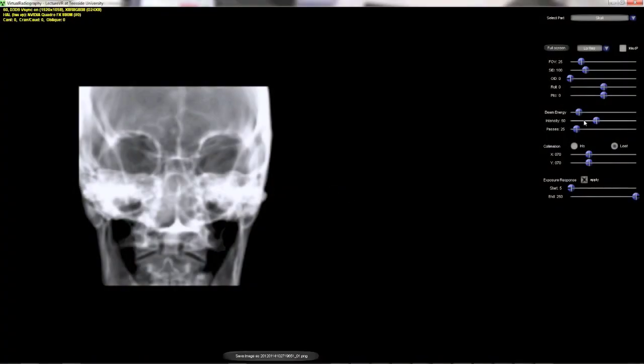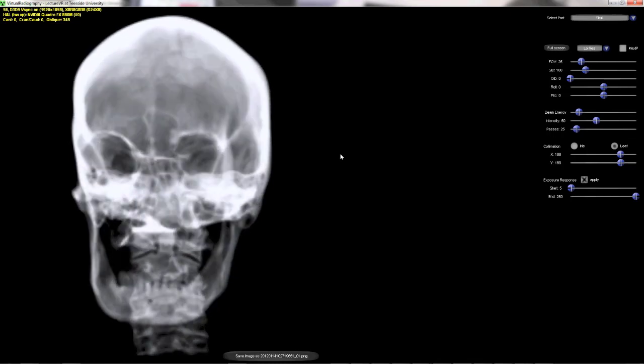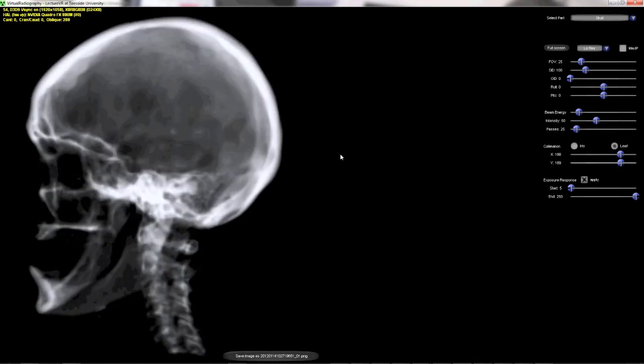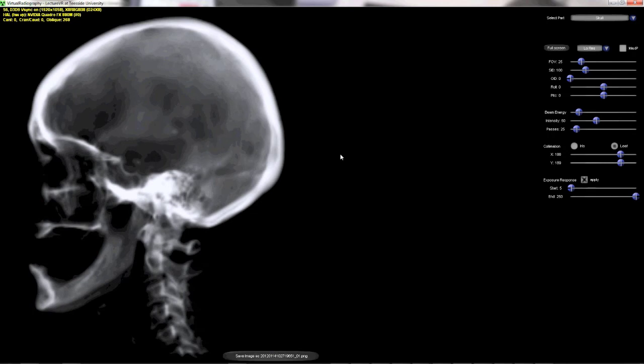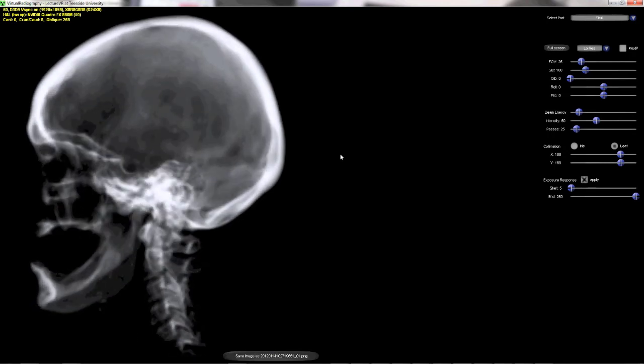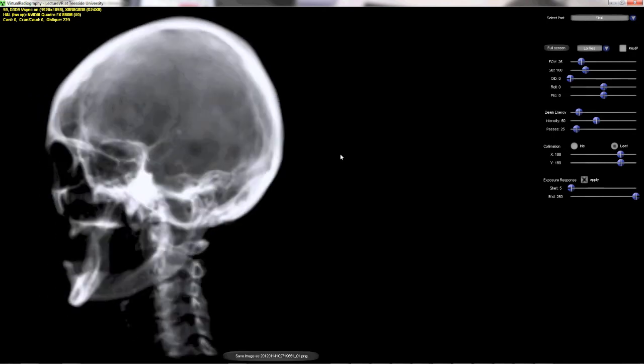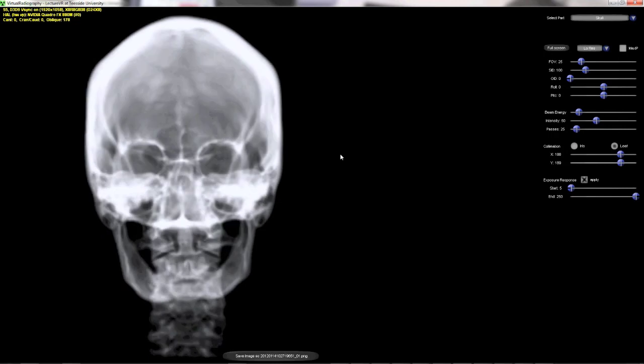We were contacted by several educators across the world who were happily using Projection VR in simulation labs, but also had some lectures where they wanted to show radiographic mistakes, such as malrotation, misalignment and distortion. They were struggling to find the rejected images that exactly matched their requirements, and it was quite time-consuming to use Projection VR to create them.